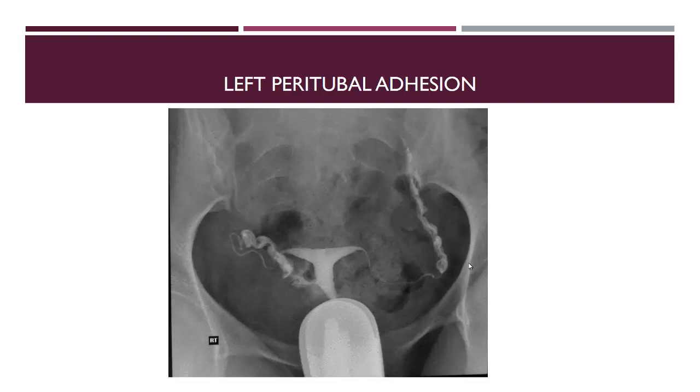Peritubal adhesions, which make a lot of dilemma for us. Is it peritubal adhesions or not? When you find that the fallopian tube is straightened like that, this is peritubal adhesions. This is a normal fallopian tube, and this fallopian tube shows normal caliber, normal mucosa, but it shows a vertical course of the fallopian tube. This is peritubal adhesions. Of course, it may be a cause of infertility.